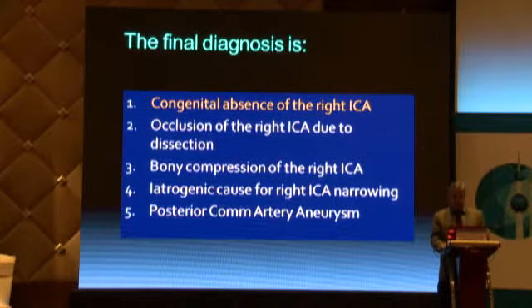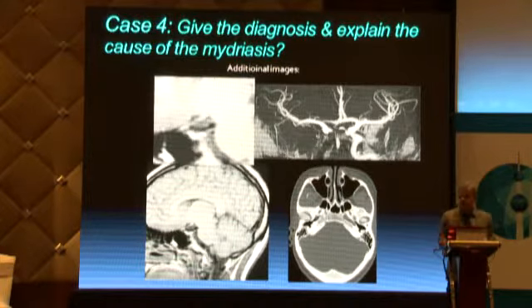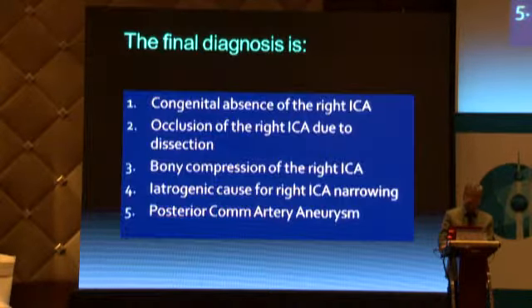And if you go back, it's congenital because you can see that the left petrous bony canal was well developed. The right one is hardly developed. So this is a condition which is from very early age onwards, and the osseous bony canal is not formed. So that's why none of those acquired conditions.